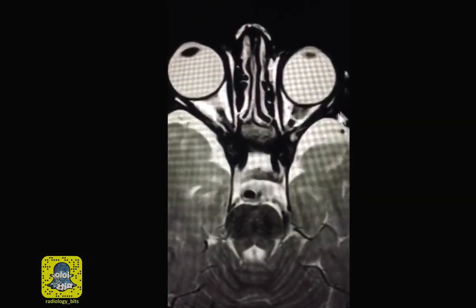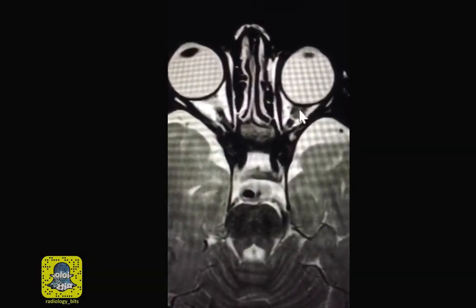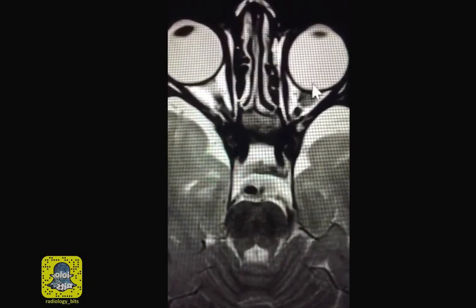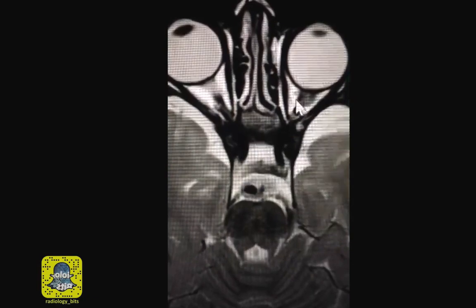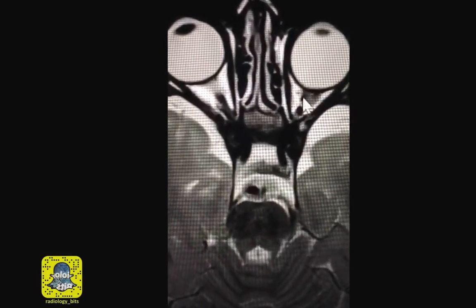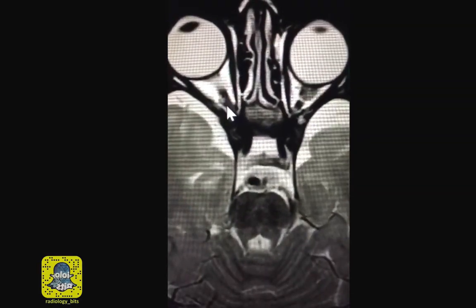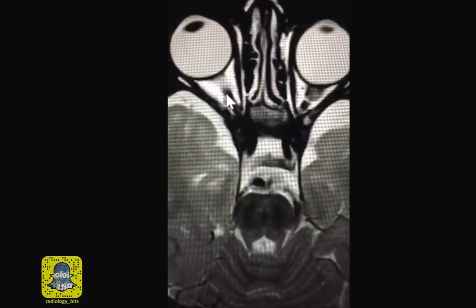The reason I'm showing the case is mainly this here. At the area where the optic nerve sheath complex attaches to the globe, you have this dilatation. It's difficult to assess this area of focal mass-like appearance on the basis of thin cuts alone. However, compare that to the normal optic nerve sheath complex on the right side, you don't see that.